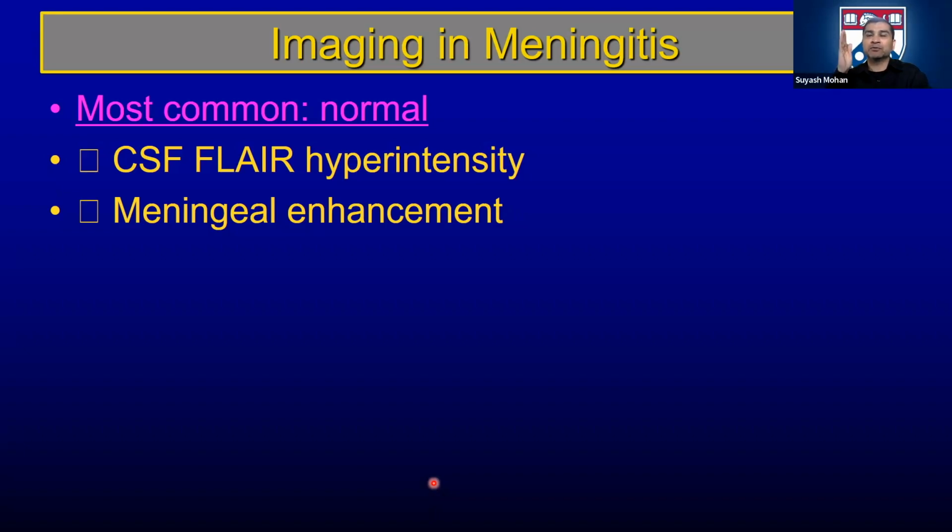Which is why, when you go through these head CTs, train your eyes to pick up those subtle asymmetries. Always compare, if you have a prior study, whether the sulci were seen better on the prior study and now they are effaced. That is not a good sign. As we age, the brain does not gain volume, the brain loses volume, so the sulci should become more prominent over time. If they are going in the opposite direction, then you are suspicious.